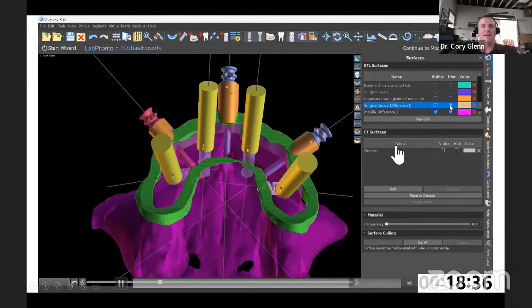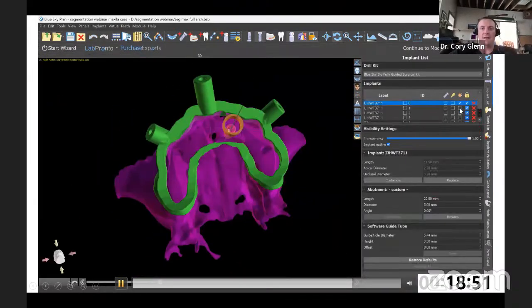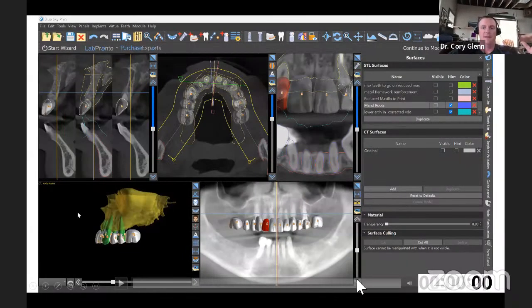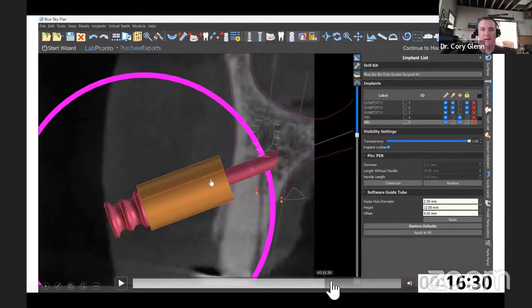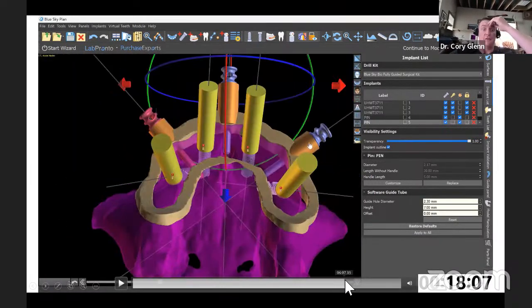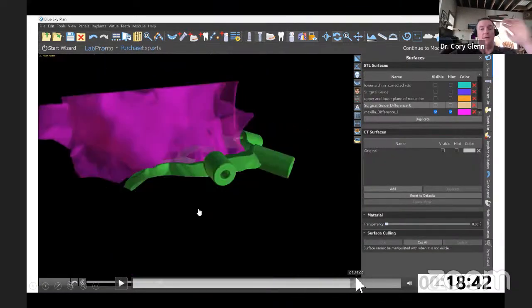Do you see, I just hit create scan appliance guide and now look what it generated. Easiest thing in the world. That was so much simpler than anything else I was doing. Crap, I keep screwing this up. All right, so now we have a perfect reduction guide and we're here.